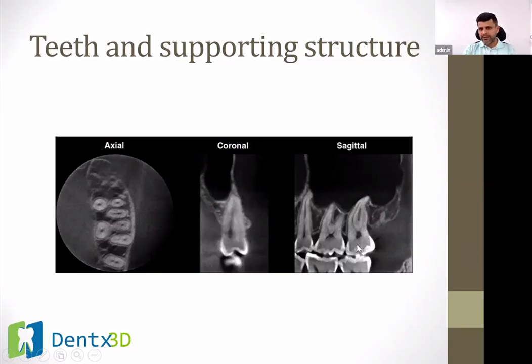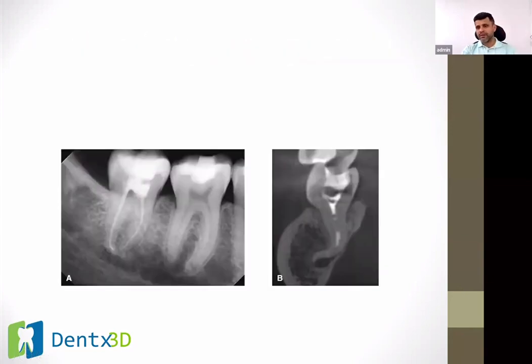Then you have your dentine. Then the black part is your pulp canal, and these black lines are your root canals. Now, if you see this, where this is ending, this is the floor of the maxillary sinus, and this black part is the maxillary sinus, right? It is so simple to read a CBCT scan. But this black part is the root canal, this black is the maxillary sinus, and this is the lateral wall of maxillary sinus. Okay, everyone is with me?